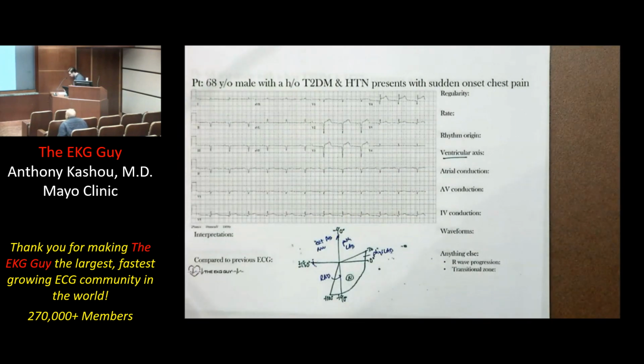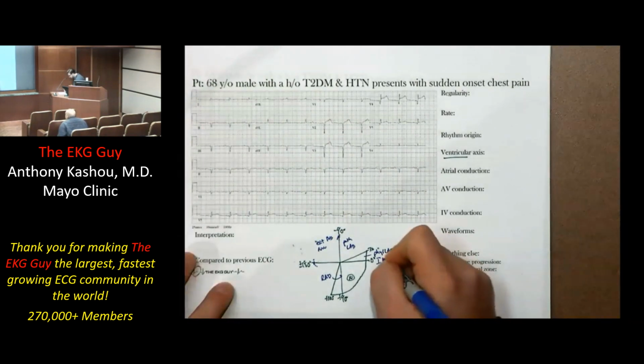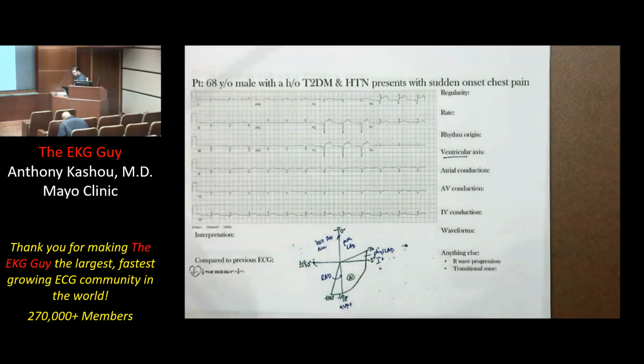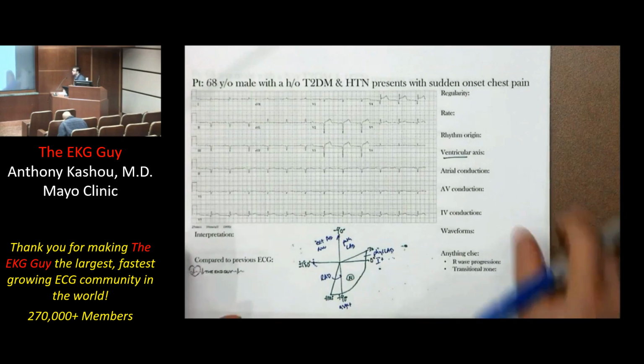All right, so when we look here, we know that lead 1 sits here, okay? Lead AVF sits here. So those are the ones that I want you to start looking at first as you're learning ECG.